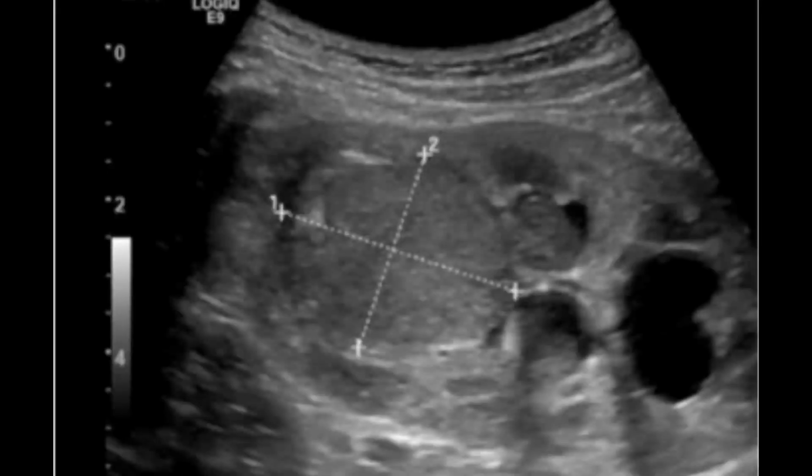I would explain this nephroblastoma as a slightly echogenic lesion with a predominantly solid spherical mass, also at the junction of the upper and middle pole. As far as obstruction or compression features are concerned, slight compressing features are there. It causes pelvicalyceal dilatation, and focal caliectasis can also be seen.